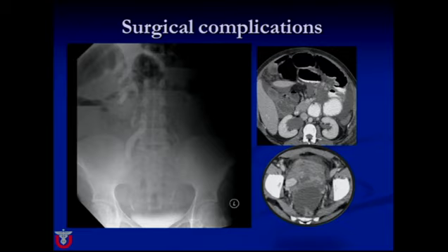She ended up having a plain film of the abdomen following intravenous contrast as a sort of mini IVP. And you can see here there's hydronephrosis on the right. The ureter comes down into the pelvis. It's dilated, but it actually is normal caliber lower down at the level of the UVJ, and the other kidney drains fine. You may end up seeing these people in ultrasound when you're asked to do an ultrasound because their urine output is decreased or their creatinine is elevated.